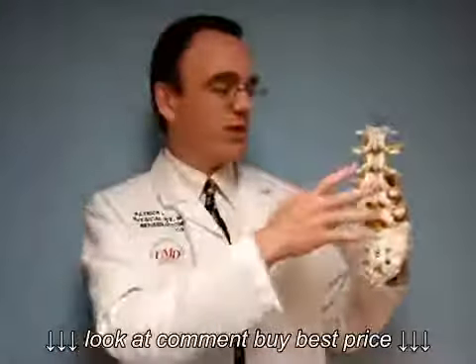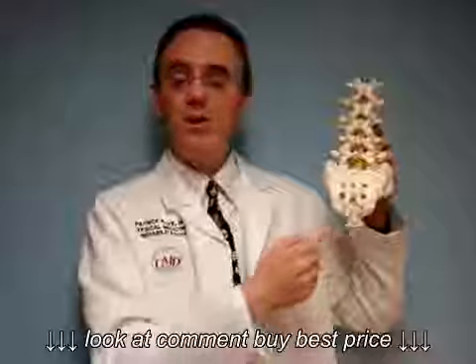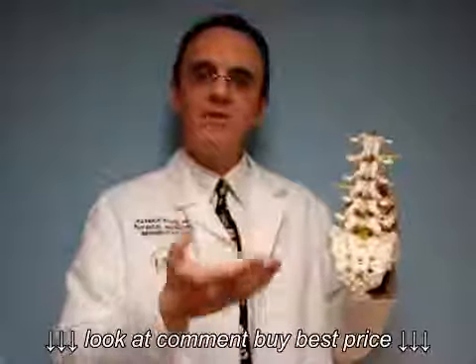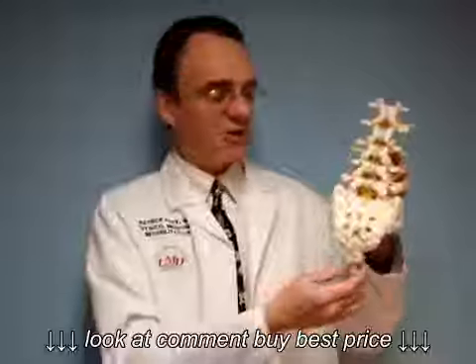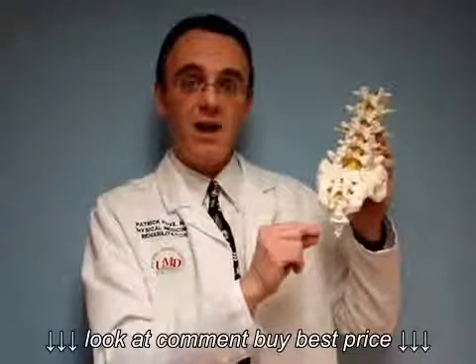And those may be terrific for lots of patients with low back pain up at about the belt line, but if your pain is all the way down at the tailbone, it probably will not get included in that image. So what you really want to do is look at the orders. Did the doctor order a lumbosacral MRI or lumbar MRI, or did he or she actually know to order an MRI that included specifically the coccyx?